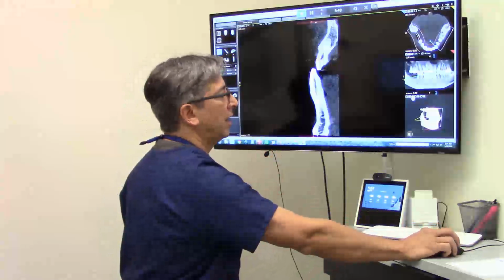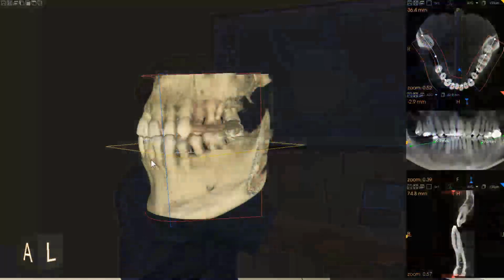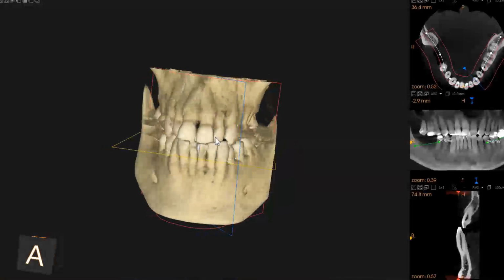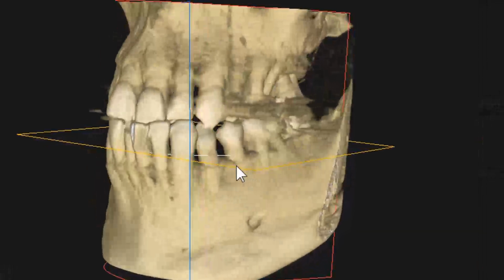If he did, you have that question with him. He actually did not have orthodontics. I know that for a fact. But if we look at the 3D X-ray here, you see he has a good amount of bone piled up here. And here's where he has just recession. So he has a little bit of a perio issue of losing some of that bone around the facial plate.